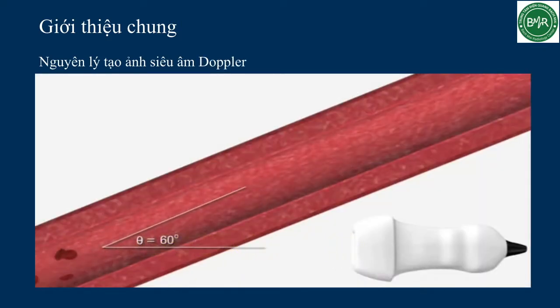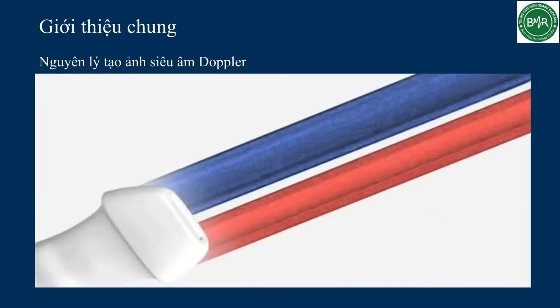Doppler images and detect the largest Doppler shift using ultrasound, the transducer must be placed at an angle of 0 degrees to the vessel of interest. However, due to practical considerations, an angle of 60 degrees is used. Color Doppler can distinguish when blood is flowing towards and away from the transducer.